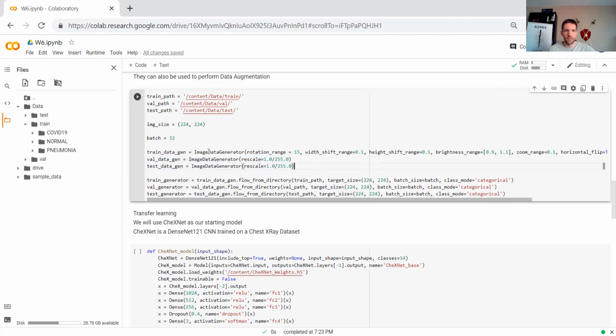And then, so we make a generator. Now we have to initialize it. For that you call it whatever you like again. This time we called it train generator. And you use the generator you already made and dot flow from directory.